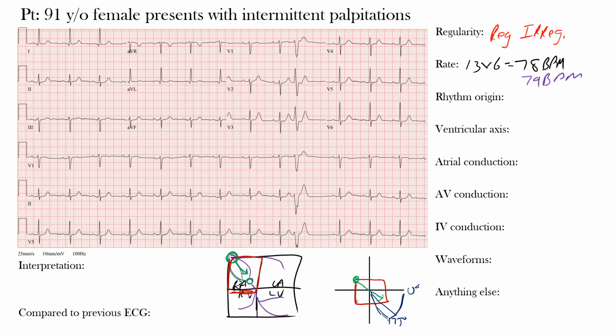And that's where we would want to see the sinus P waves heading in that direction, coming from that sinus node. And what you'll want to do now is put where those leads are placed. So remember, lead 1 is here at 0 degrees. And then you have here positive 90 degrees where the positive end of lead aVF sits. And then this would be plus or minus 180 degrees, and this is negative degrees. We'll talk about that when we talk about ventricular axis next.